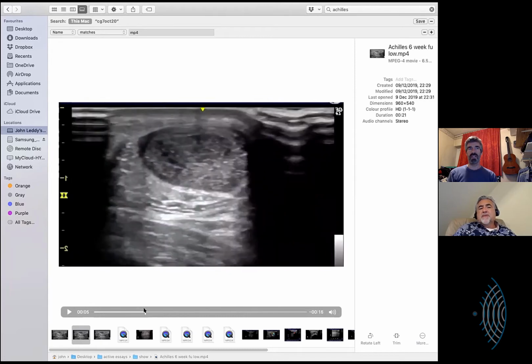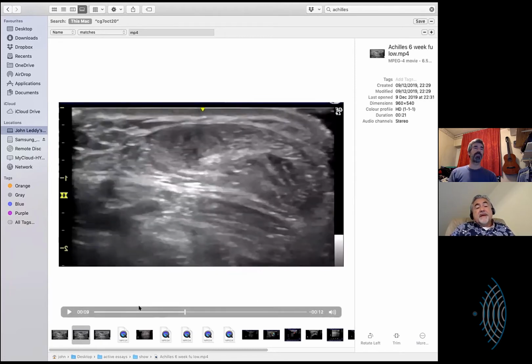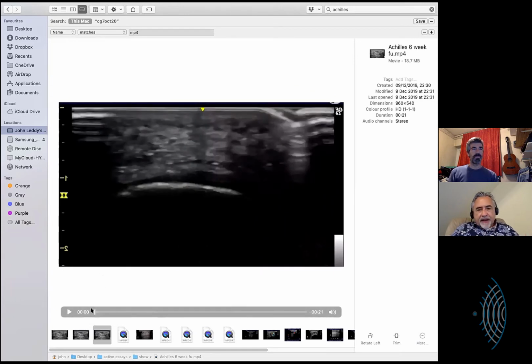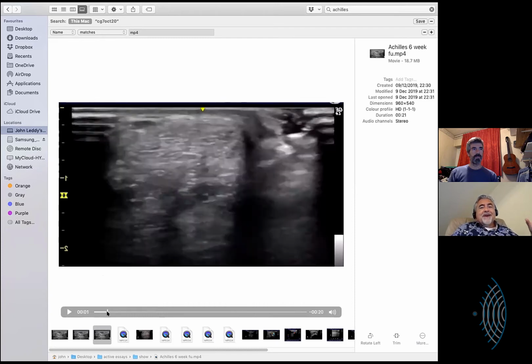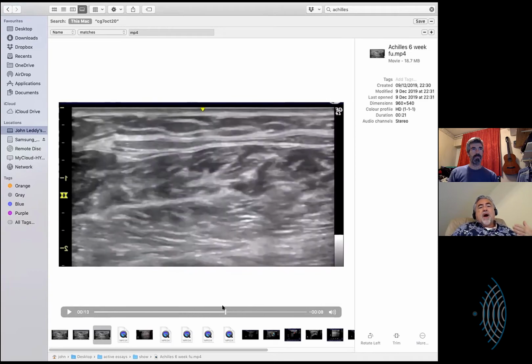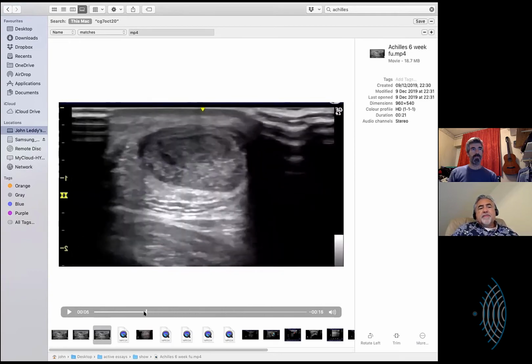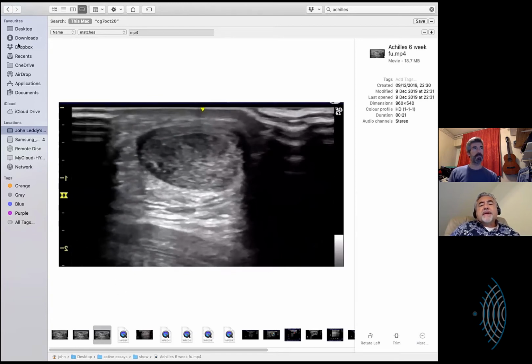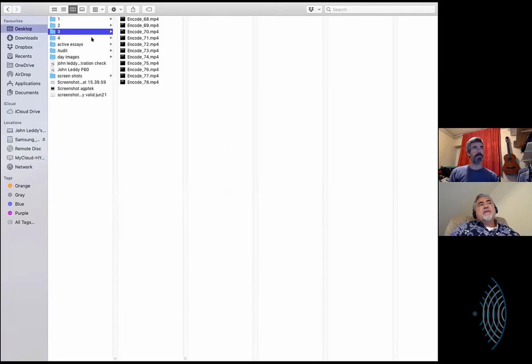Yeah. No, that's actually brilliant. That to me, that's very helpful. On your very first image that you gave me this evening, I'll put it in your context, on the long axis, there appeared to be vascularity into the complex of the whole Achilles tendon. Give me your take on the so what of that.